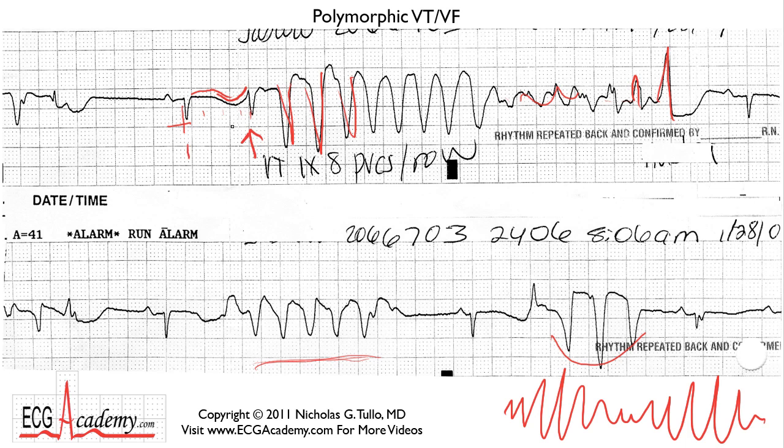Look how slow it's coupled. It's coupled at a rate of about 68 or 70 beats per minute. And then you get sort of this takeoff. There's a little bit of a warm-up in the tachycardia before it kind of finally peters out, and then you have a normal beat again. Torsade de pointes can be non-sustained, or it can become sustained and can even degenerate into ventricular fibrillation.